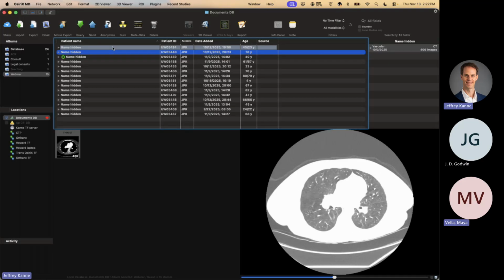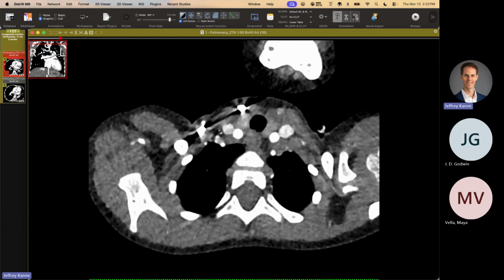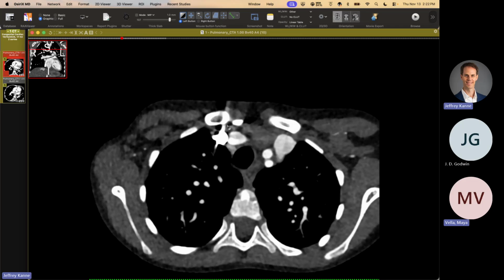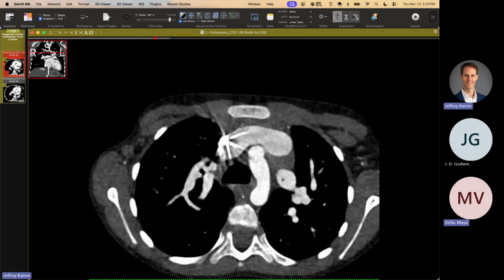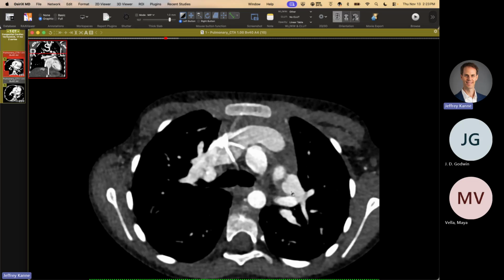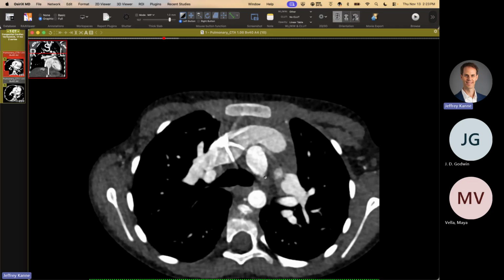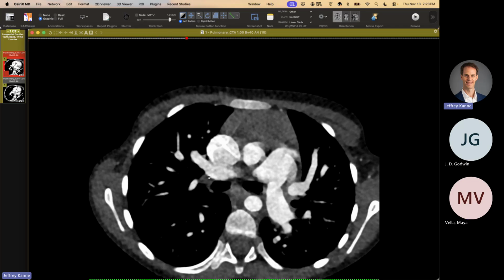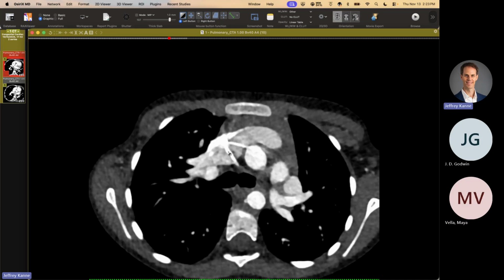All right. So I'm going to be on a little bit of a vascular theme today. This is a cool case. I think this is a 4-year-old who has some really cool anatomy. You can see, first of all, we've got this funny vessel coming in here. We've got this left superior pulmonary vein draining into the brachiocephalic. We have a left aortic arch, but we also have this right superior pulmonary vein draining into the superior vena cava / brachiocephalic vein. So both the upper lobes have anomalous venous drainage.